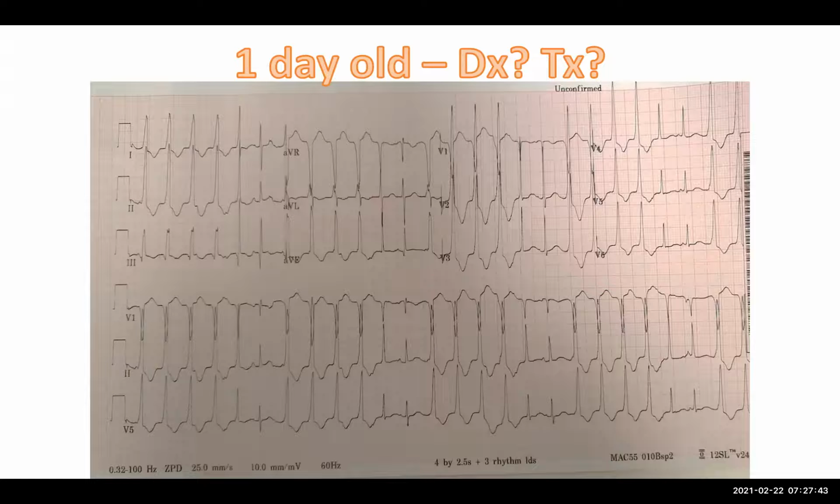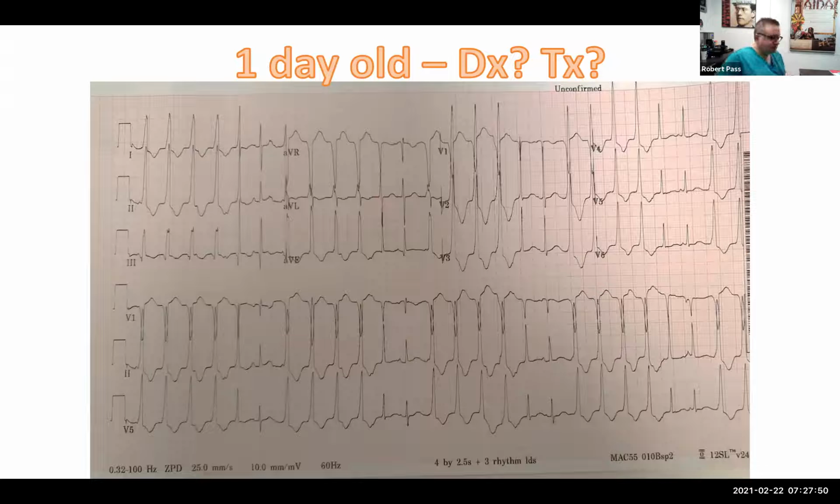So it could be an idiopathic ventricular rhythm. Yeah. This is some kind of accelerated ventricular rhythm, or if you want to call it VT, you can call it VT. And the narrow beats are sinus capture beats. And you're correct, David, that the rate of the sinus beats, and you can only tell that from these 2 beats and these 2, are very similar to the VT beats, or the accelerated ventricular rhythm.